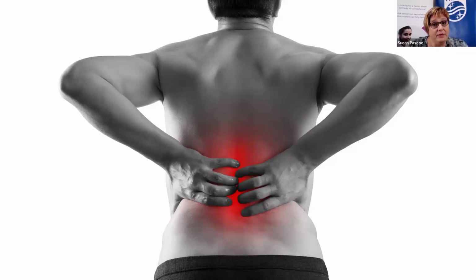Often the patient's body habitus might influence what imaging modality we choose, because as we know, those patients with larger BMIs are not the most ultrasound friendly, should we say, to image. If you're looking for a tiny little calculus that might only be 5 millimeters or 6 millimeters, it's very hard to see some of those on ultrasound, even in ideal patients. So an increased body habitus is a contraindication, if you like, for ultrasound imaging.